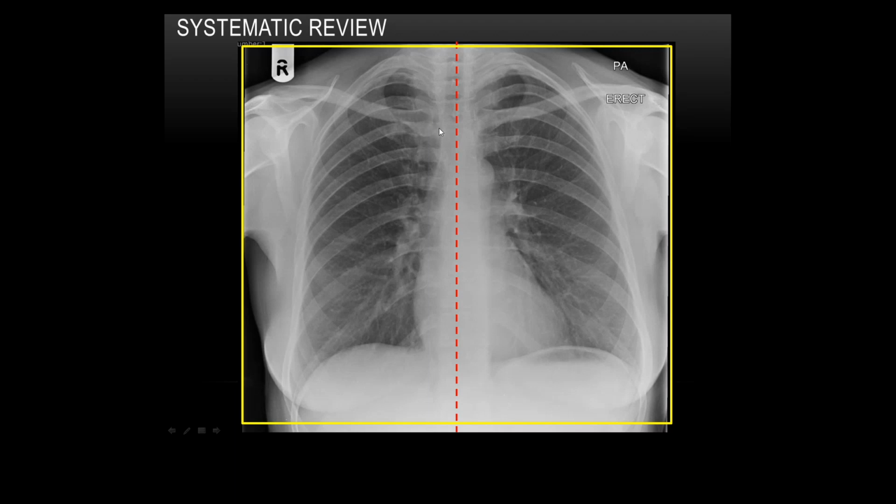You don't have to be bang on 1 centimetre, 1 centimetre. It could be 2 centimetres, 1 centimetre. We'll still class that as straight, because for some people it's really difficult to get them straight. But if there's a wild difference between the two, then yes, it is going to exaggerate things. So it's one thing to keep an eye out for.